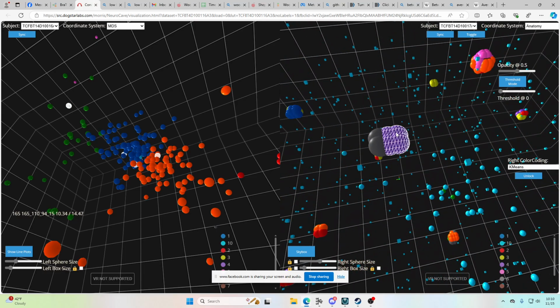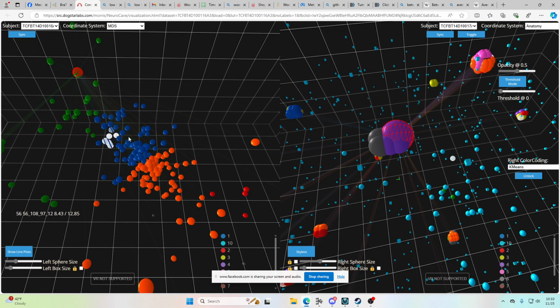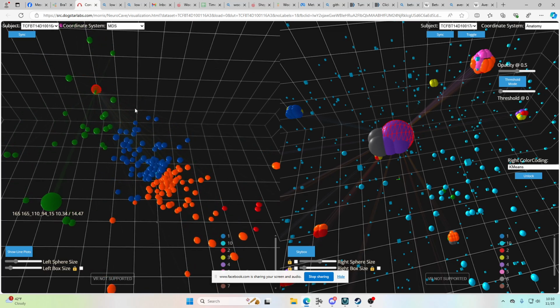Similarly, if you're interested in a particular tumor, you can mouse over it and it highlights which cells in the dimensionality reduction view correspond to it. You can click on the tumors or the tumor regions, and it creates edges that show which other tumor regions have the most similar data to it. I clicked there and it highlighted this one over here and displayed the edges.